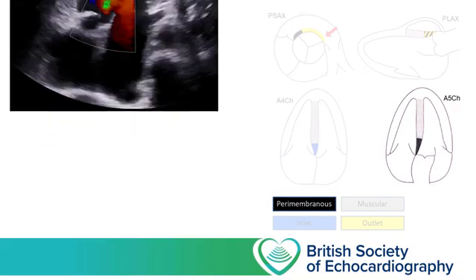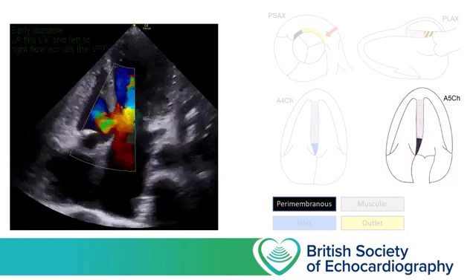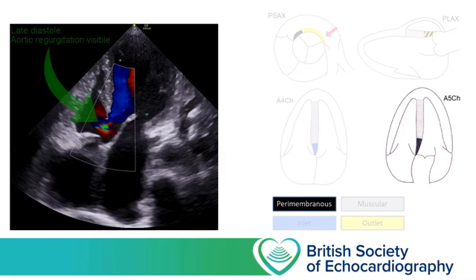Understanding the colour flow here can be quite challenging, so as always the solution is to slow down the clip, pause if necessary, advance frame by frame, and this will help you to see where blood is moving from and to, and during which phase of the cardiac cycle.